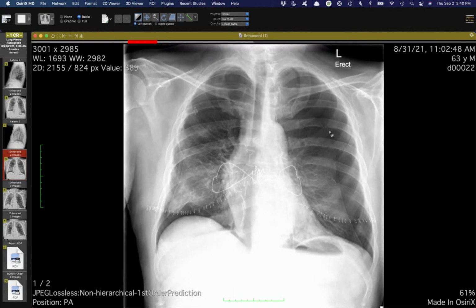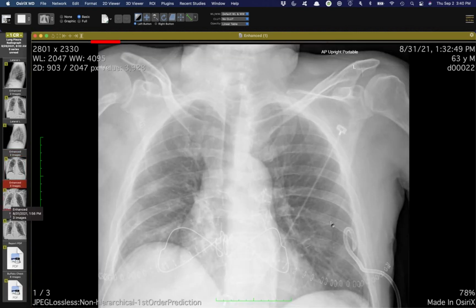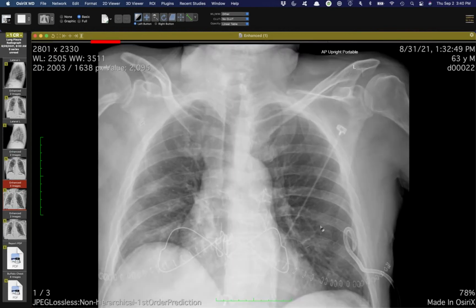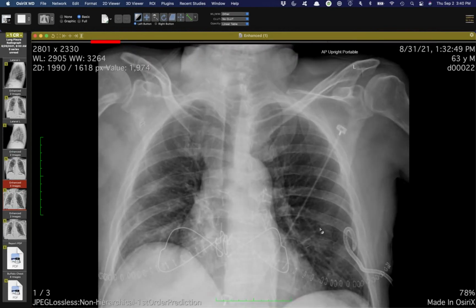And you can see here that they have bilateral pneumothoraces, fairly sizable. And Howard talked about explosive pleuritis. This is another pleural disease, not explosive, but here we can see, and no surprise, they put in one chest tube in this patient on the left, and both the pneumothoraces have resolved after that. So of course, this patient does have acquired buffalo chest physiology or anatomy with communicating pleural spaces.